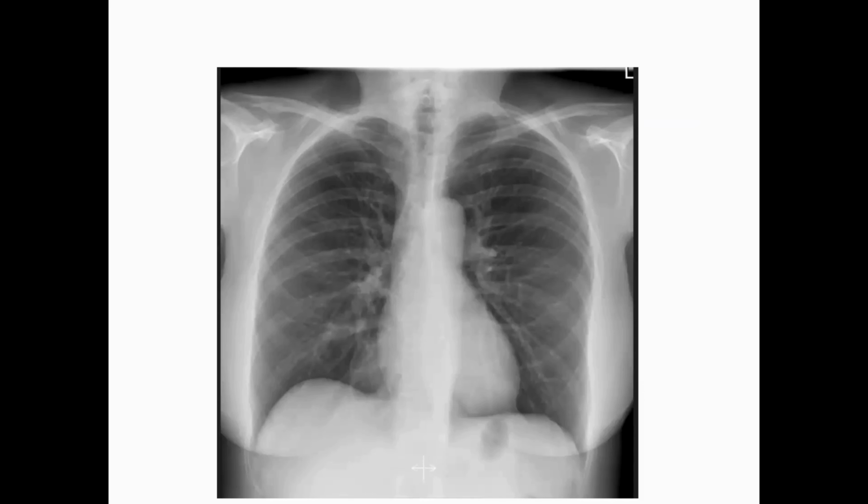So this is the normal chest X-ray. Just to recap what we had in the last session, we discussed the quality of the assessment, how we're going to see that the image is of good quality. We're going to see the rotation. We discussed the rotation, how we're going to see the inspiratory film projection and also penetration, and also how we're going to identify that this is a normal chest X-ray based on the ABCDE approach, because if you know the normal chest X-ray, you will easily pick up an abnormal one.